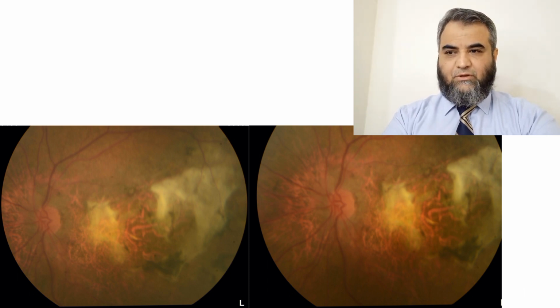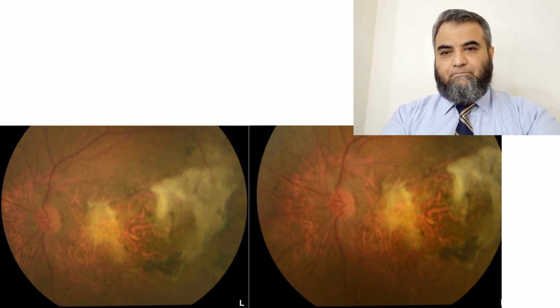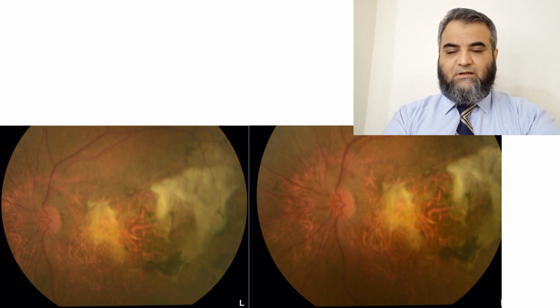These are the photographs. Here we can see the left and the right slides, where there is a grayish-white subretinal membrane occupying the central macular area and extending temporally also. Inferiorly, you can see some pigment changes, pigment clumping. So this is a classical photograph of a patient suffering from cicatrized choroidal neovascular membrane and age-related macular degeneration, wet type.